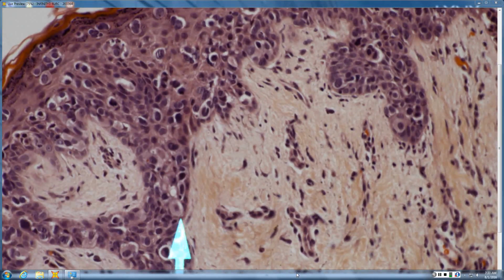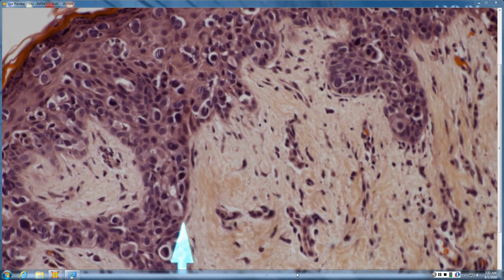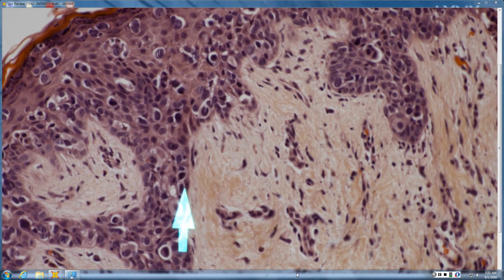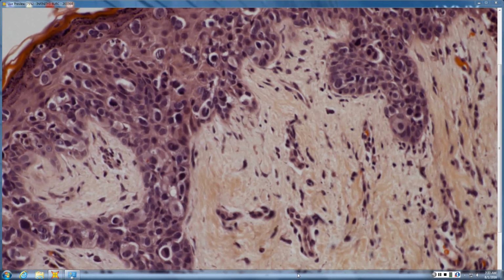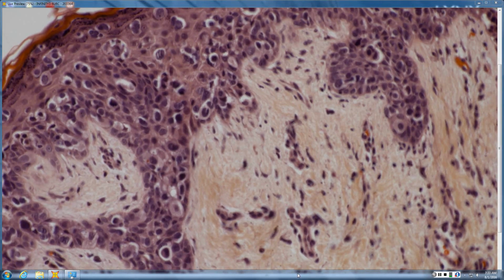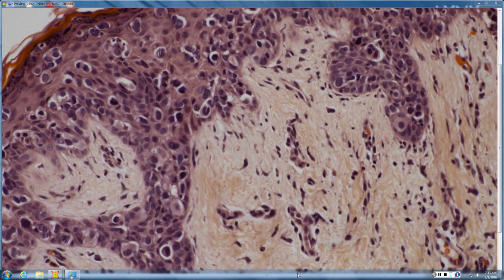I guess it is kind of crushing, so if it is crushing, it would lean away from melanoma, but I honestly can't tell very well. Yeah, you sort of have this row of nuclei below the abnormal one. And again, here, that counts. Okay, so it's not going to be likely melanoma. Another one there. So less likely melanoma when you see that. But you can always confirm with immunostains.